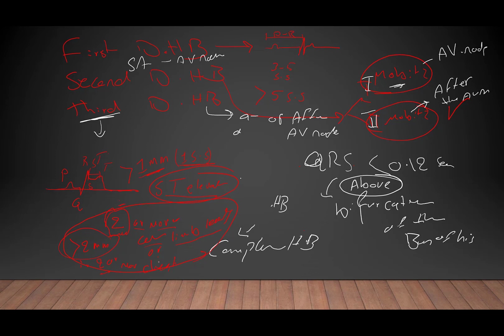It's most commonly caused by acute full thickness MI. Okay, acute full thickness MI means that it is transmural.